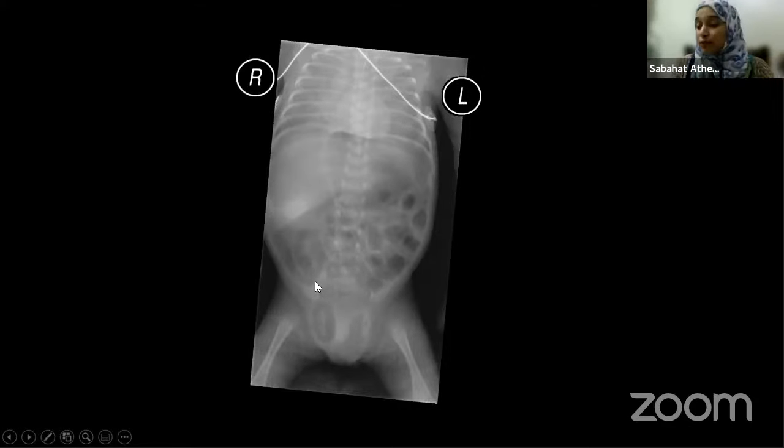It is a very simple finding, you might say. But at times the examiner is waiting for you to say this. Do not presume that other person knows it. Do not presume. Describe everything. Describe every catheter, every line, and mention all the extensions. So rightly said, very well done that there is air in the hemiscrotum as well.